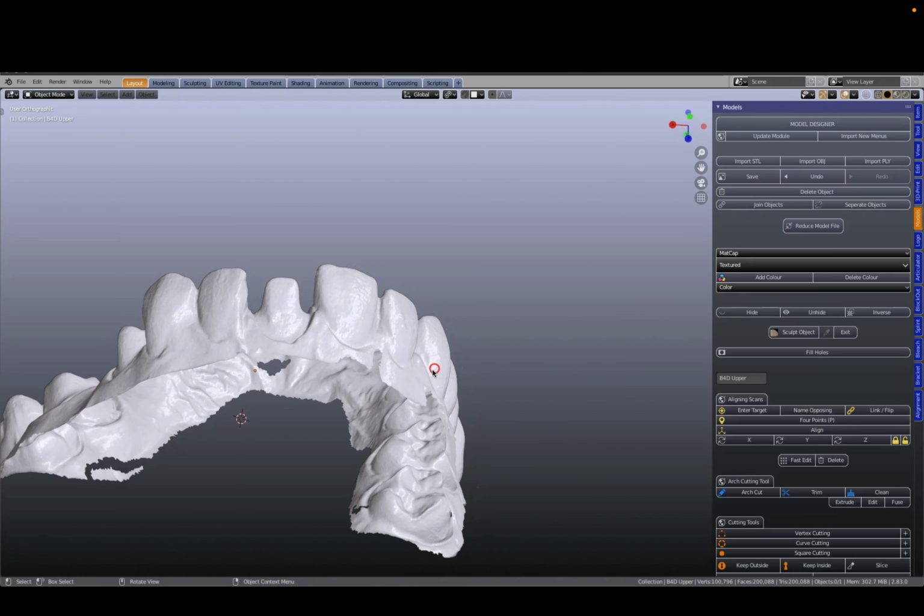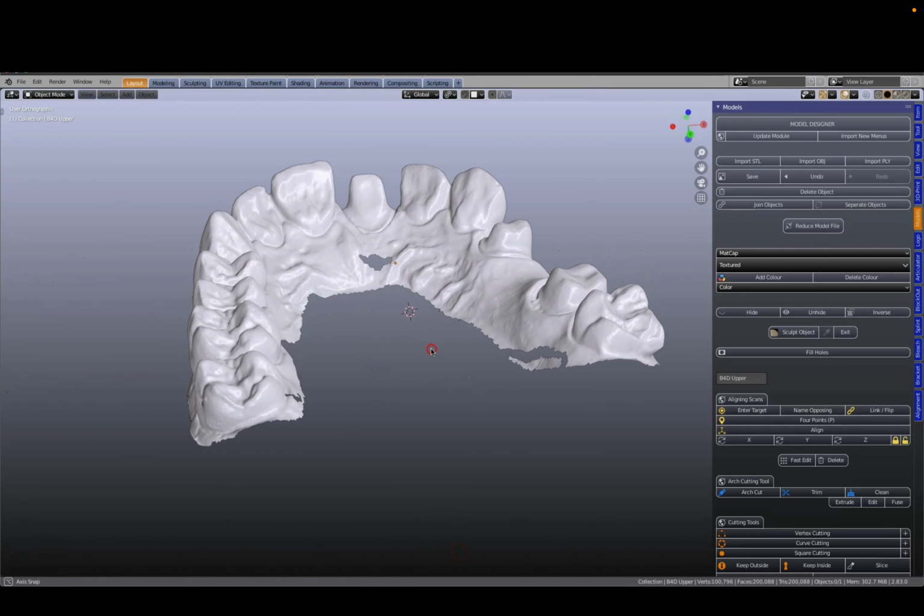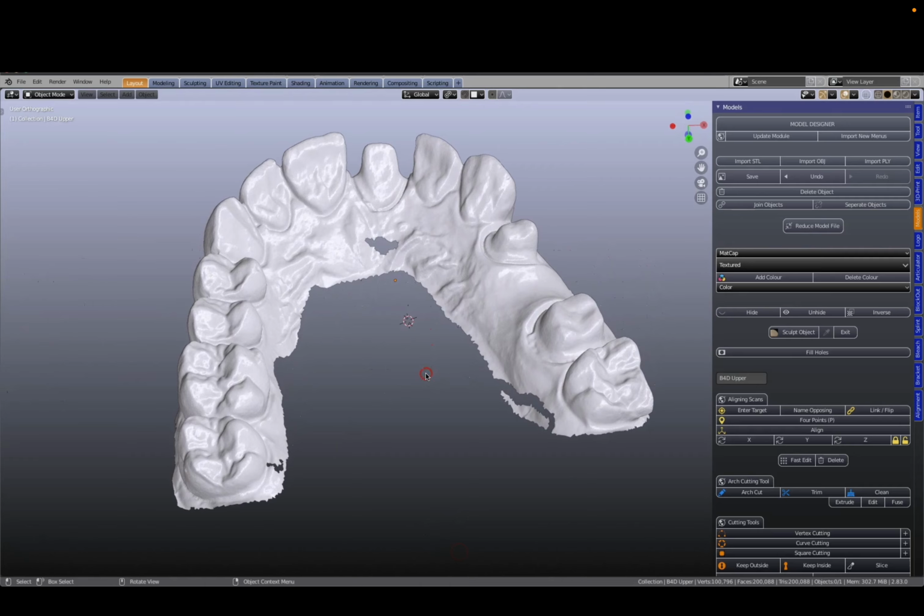We have split the editing scan defects into several short videos. Please follow these videos before constructing the model base. Let us begin by inspecting the scan. There is a hole in the palate. There is a rip in the posterior section with some free-floating excess mesh. The borders are fairly irregular, and there are several smaller holes in other areas.